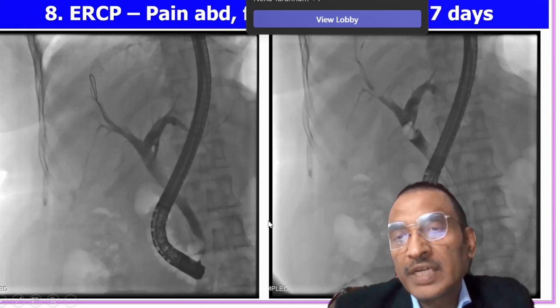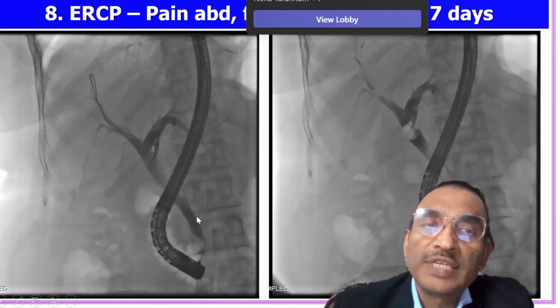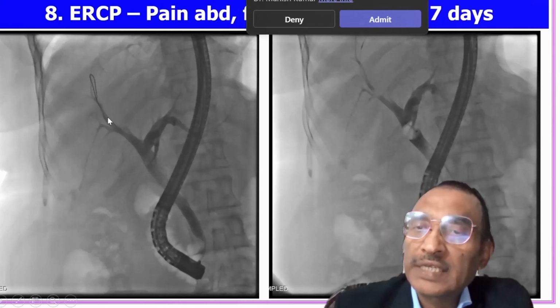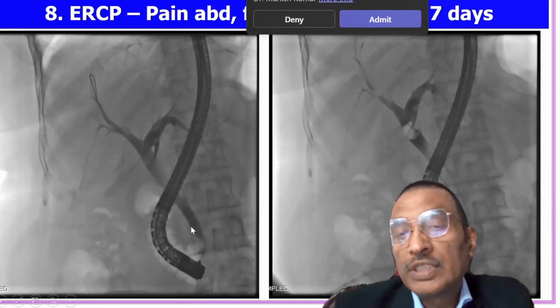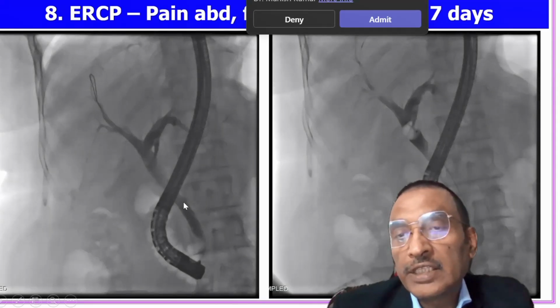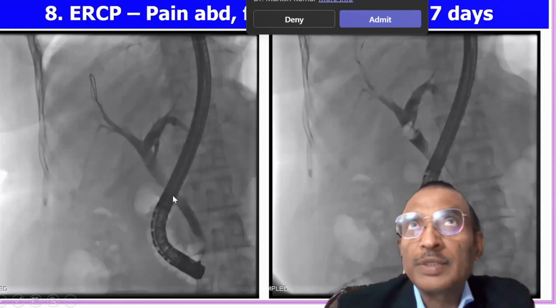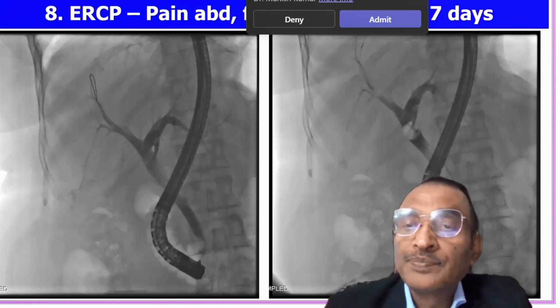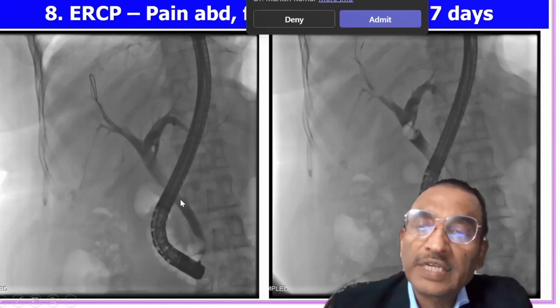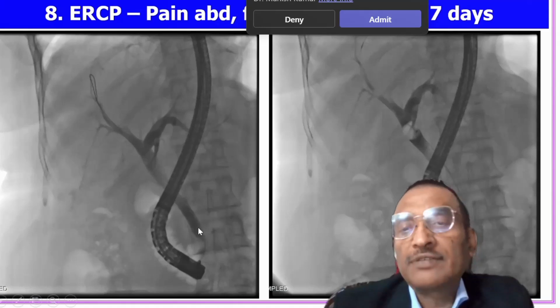What you are seeing here, again, what we described, is an ERCP image, cholangiogram. Pancreatogram has not been obtained, it is not injected, so contrast has been injected. When we are doing it for a stone, it is very important that we pass the catheter intrahepatic and start injecting from above. Why? Because if you start injecting from below, the stone tends to get pushed intrahepatic. And the second precaution one should take is that contrast should be diluted contrast. It should be diluted with one third of the saline, one third of the volume of the contrast, or up to half of the volume.